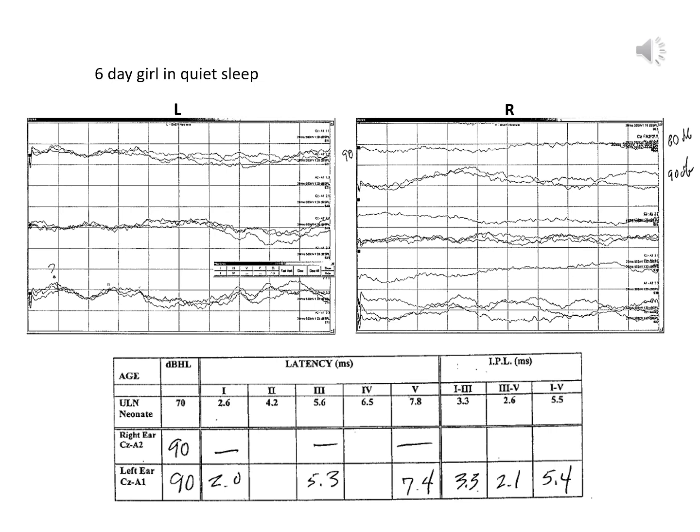When we see recordings that are this poor, where we can't really see waveforms, one of our first questions is about the quality of the recording and whether the baby was moving and crying. And that would affect the quality of the recording. But with the technologist telling us that this is in quiet sleep, we know that the baby's condition was quiet, and so it's probably not due to artifacts. And so the absence of waveforms in these tracings is probably due to a real clinical problem.